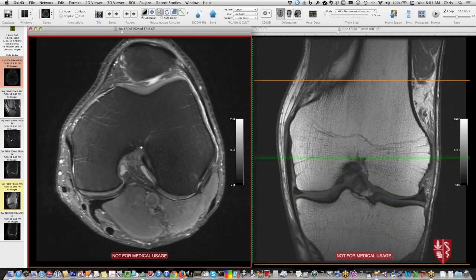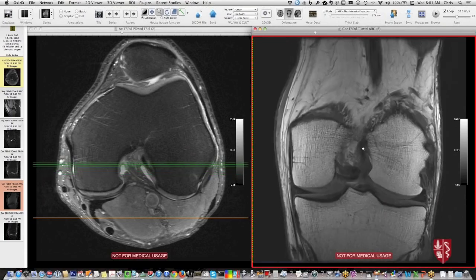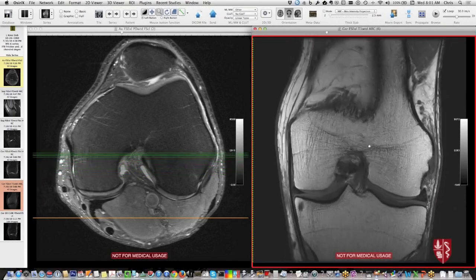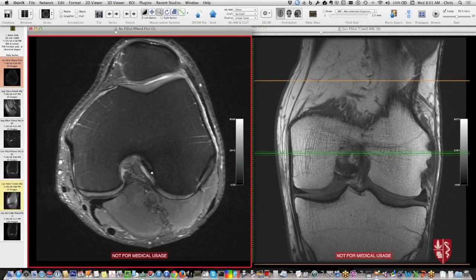Maybe one of the most important things to check on the axials is the anterior cruciate ligament. Here, lateral femur, this black band right there, that's all ACL. It should be a centimeter and a half or so in AP diameter, because remember, it was coming off the inner part of that lateral femoral condyle and sweeping down. So that's ACL there. It's critical to get good at looking at it here, because if you have injury to the ACL, it's typically proximal, and you're almost always going to see abnormality on the axial.